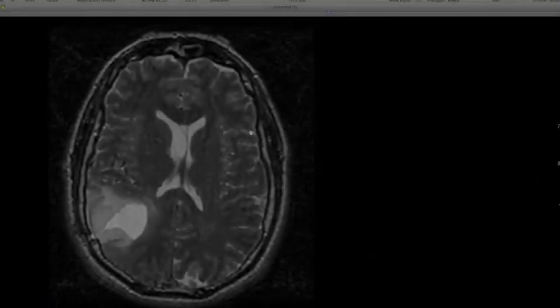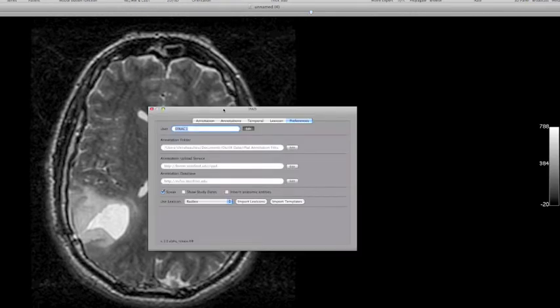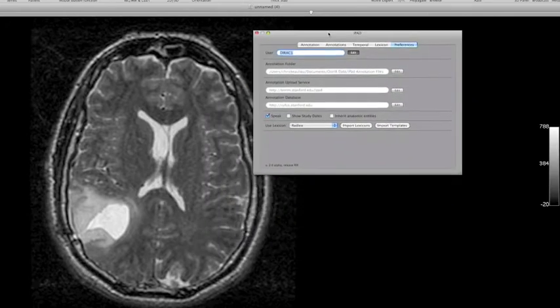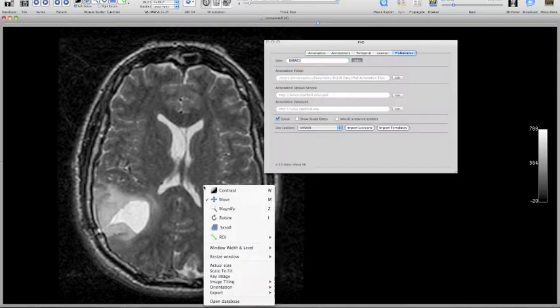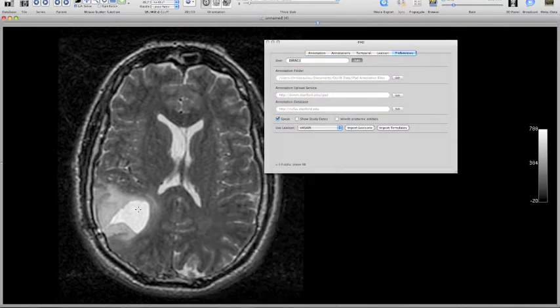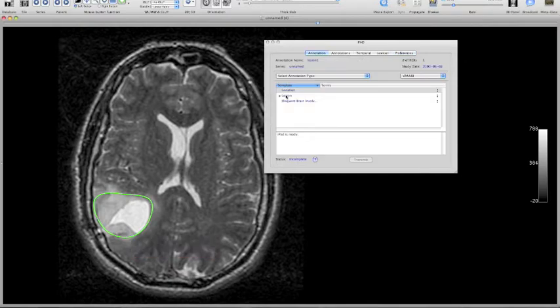Go ahead and shift this over, and then I'm going to open up the annotation tool iPad. iPad is ready. iPad is an interactive device that allows us to capture structured annotations on medical images. I'm going to choose the Vasari template for the lexicon, and now I'll place an ROI on the lesion in this patient's brain. I'll draw it kind of coarsely for this demonstration purpose. Next, I'll give the lesion a name. And now we're ready to annotate.